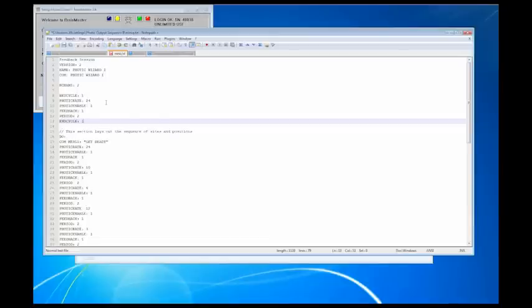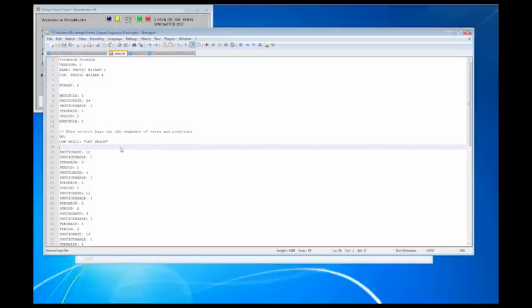Okay, so now what I've done here is I've created a cycle at the photic rate of 24 hertz, that says that photic is on, has feedback of 1, and goes for 2 seconds. Now what does this mean to you? Well, this means I can technically delete this, and at this point in time I can type do cycle 1. The benefit of doing it this way: cycles you can create to do more than just one rate or one thing.